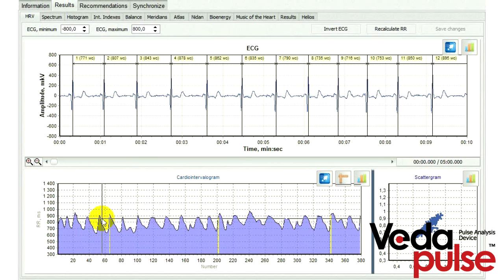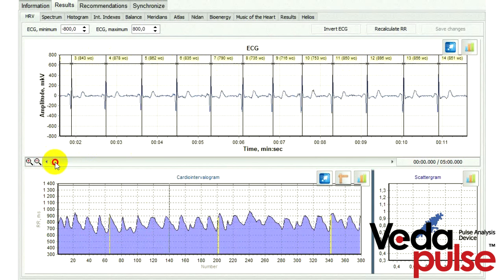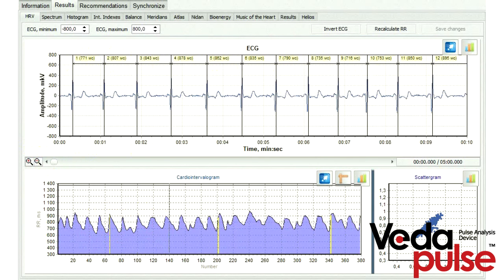With this disorder, you will see breathing fluctuations of RR interval duration on your electrocardiogram, and their duration will differ in time by more than 15 hundredths of a second. And when holding the breath, this arrhythmia disappears.